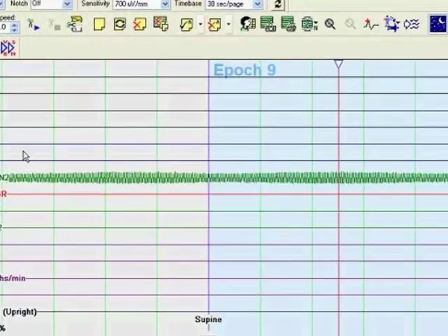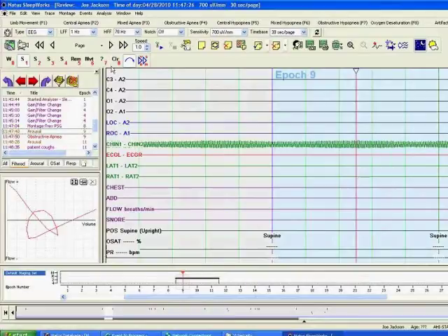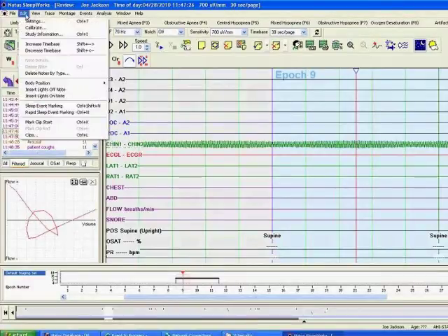If Joe tried to make a change to any of the settings, again he is faced with a message. Alright? Now, this restriction that you're seeing right now, where you can't go into the settings menu, corresponds to that setting that says configuring system options. So if you were a technician, you would not have access to the settings menu.